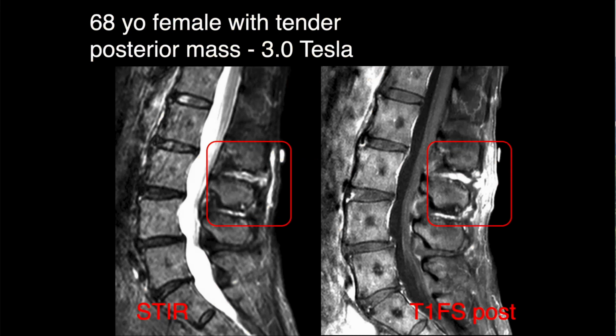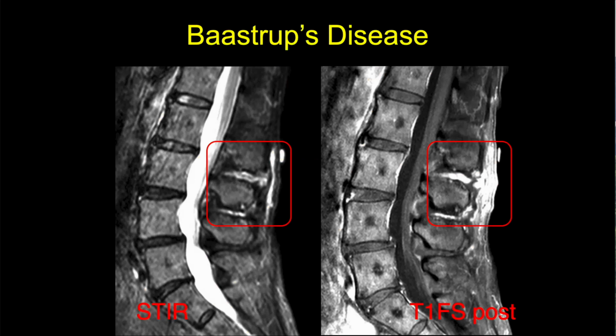Could this be ligament tears? These are chronic degenerative tears of the ligament here, and it's really considered a degenerative disease. You can see all the subchondral cystic changes and eburnation of the adjacent bones, and these are degenerative tears. It's called Baastrup's disease. When you get a hypertrophic bone like this, it's degenerative disease.